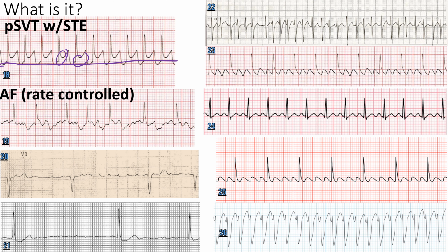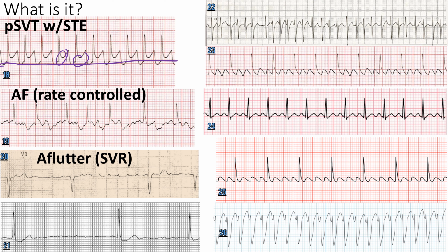And then the bottom left there, AFib. You can see the difference between that slow A flutter and a slow AFib, right? Fib literally has fibrillatory waves. You can't really ascertain that they have any kind of organization. Just like comparing 22 and 23. They're both RVRs. Which one's AFib, which one's A flutter?